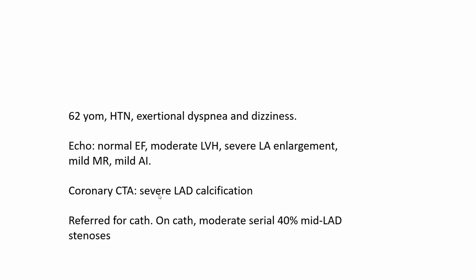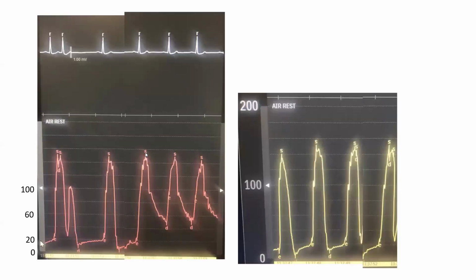Coronary CTA shows severe LAD calcification. So he was referred to us for coronary angiogram. And on coronary angiogram, we found serial 40% mid-LAD stenosis, not significant by IFR. We did the standard left heart catheterization and pullback, and those are the waveforms.